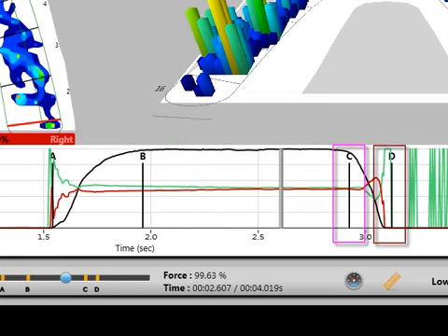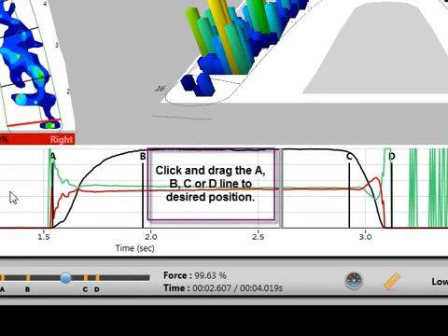The majority of the time, the default will be correct. However, this may not always be the case based on the patient. In this case, you may wish to move the lines manually. To do this, click and drag the line to a new position.